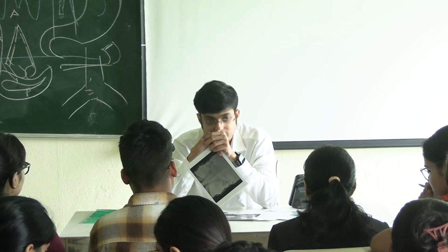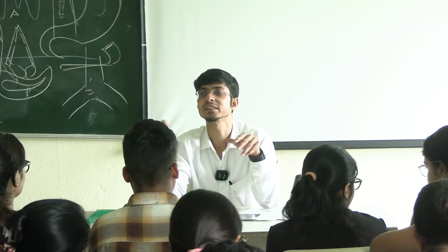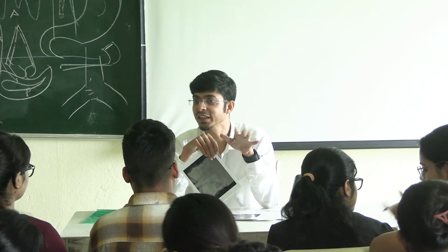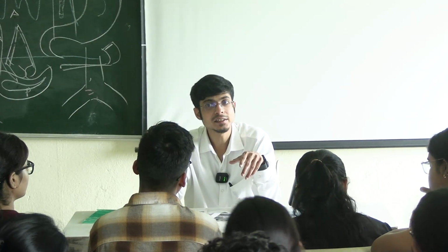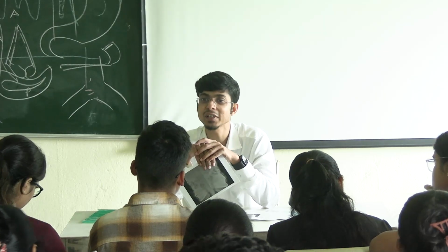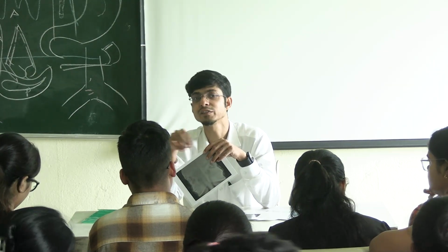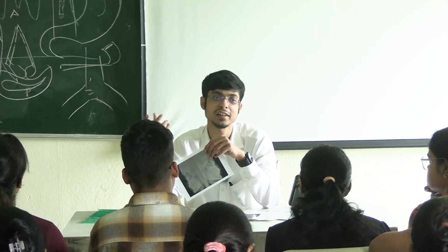Okay. তারপরে we'll see the other parts of the lung fields, the bronchovascular markings, the basal segments, the costophrenic angles. If you can see any Kerley's lines or something like that, if there is pulmonary edema. And then we see the lung fields, if there is any patch, consolidation or anything like that.